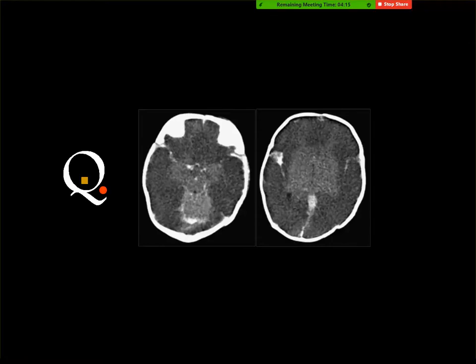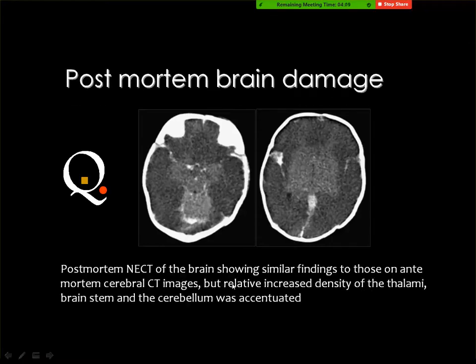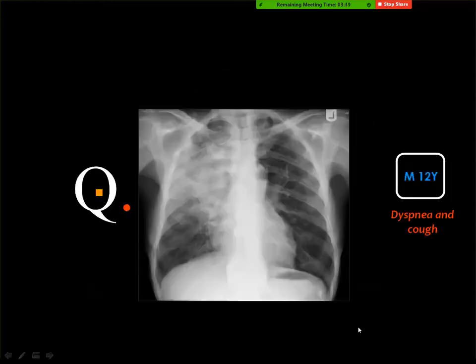Hypoxic ischemic encephalopathy. Yes, and this is hypoxic ischemic encephalopathy with profound ischemia. And you know that it is profound by the presence of multiple hemorrhages, which mean that the vessels feeding the wall of the arteries are also affected. Then the arteries are damaged and they bleed. And whenever you see this, you know that this patient is about to die or even he is dead as well. Okay.